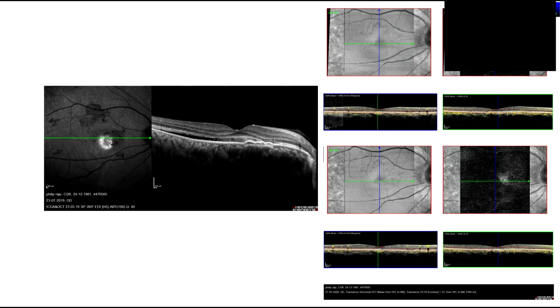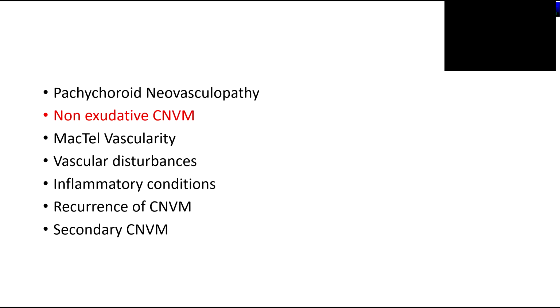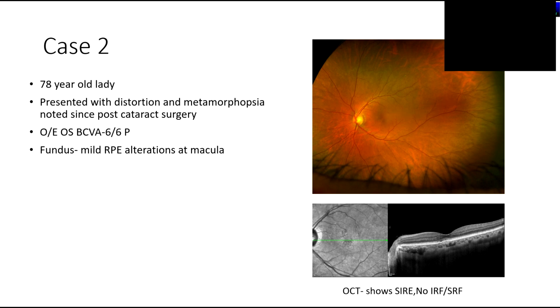Networks. Again, here there's some shallow fluid, and then the FIPED, or the shallow irregular, which is the diagnostic OCT sign corresponding to an OCTA vascular network underneath. So in pachychoroid neovasculopathy, the angiography shows a lot of information, but the OCT is diagnostic.